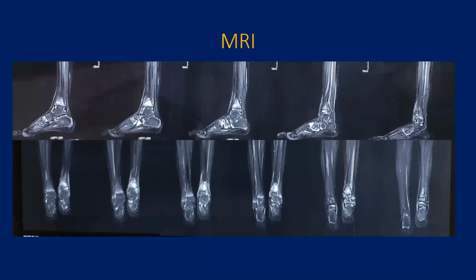Can you go back one slide quickly? So although we saw some changes in the foot area, mid-tarsal area also, I got puzzled at this point that there's something wrong at two places, but still, as the pain was localized to the ankle, I did a tibial biopsy, which was kind of non-conclusive. Yeah, now you should move ahead.